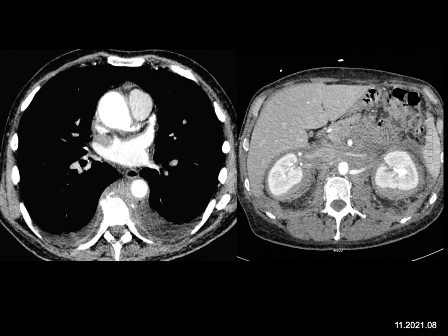So it's a really interesting case, and we've seen a few of these. Patients are often not diagnosed correctly. You can also see infiltration around the aorta. It looks like an infiltrating vasculitis type process. It's super hot on the PET scan, and it can involve the aorta anywhere from the root through the iliac vessels. It's just a wonderful diagnosis.